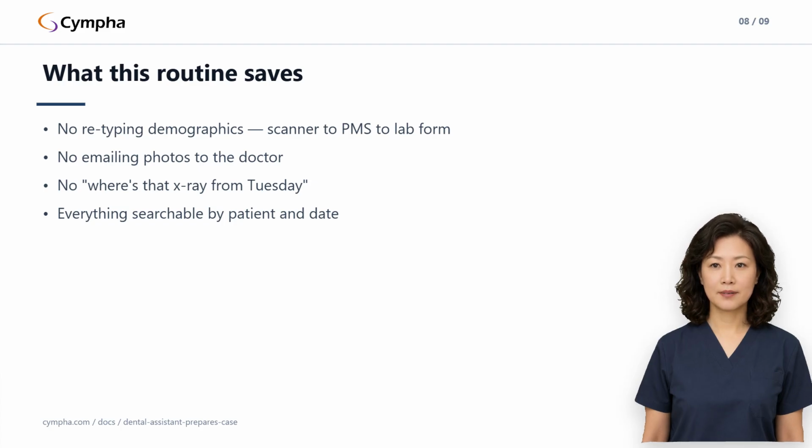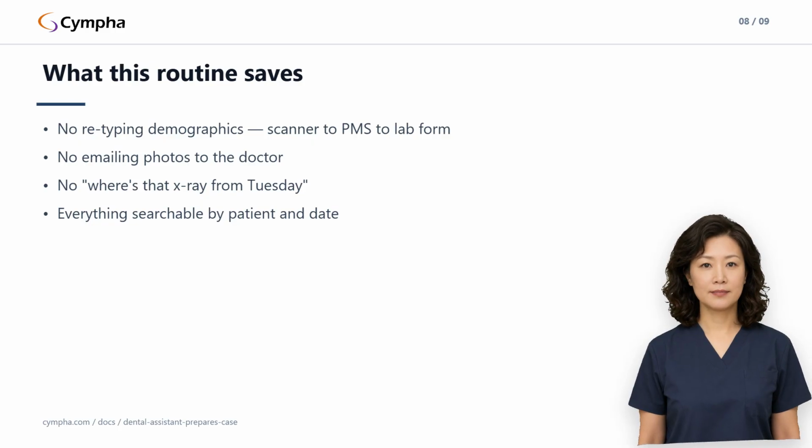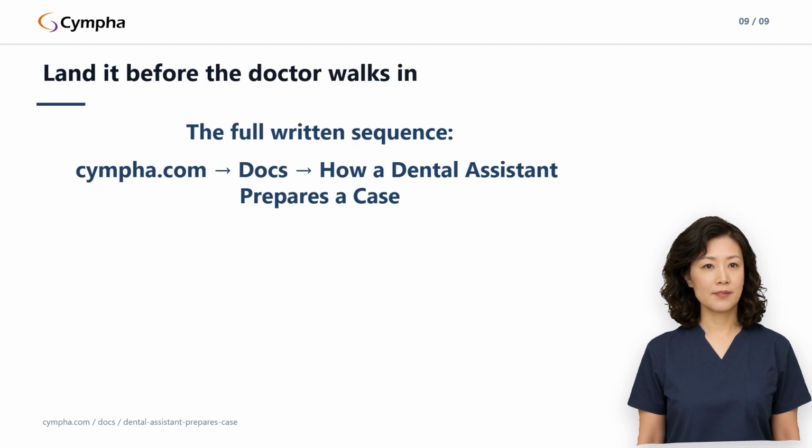Multiply those minutes across every visit in a day, and the prep sequence you just learned is one of the highest leverage habits in the practice. So that's the routine. Create the clinical case, shoot the photo sequence by phone, land the scans through the agent or the drop zone, type the scratchpad notes, and hand off. 5 steps, same order every visit, and the same phone every time, because the routine is the point.